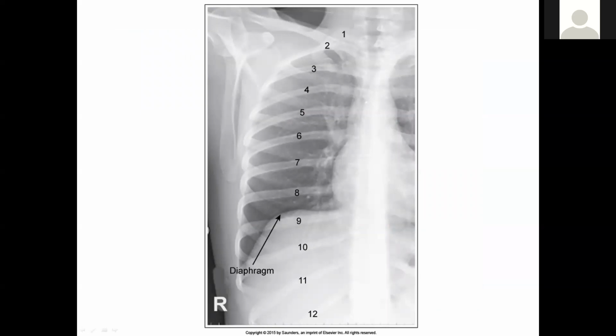This is a unilateral right ribs. I recommend marker placement up in the corner, even though it's overlapping shoulder anatomy rather than down and bottom. So this could be AP or PA. It's important that you annotate that for the radiologist so they have all of that information.